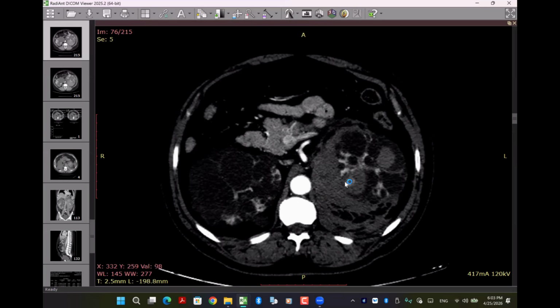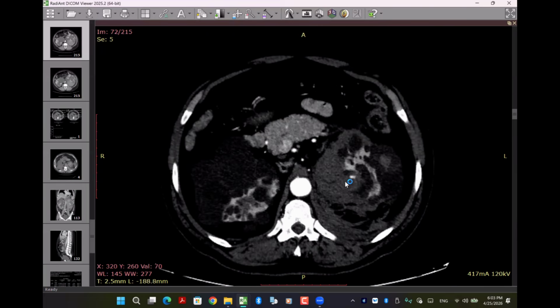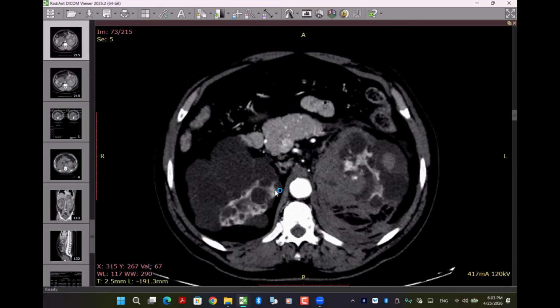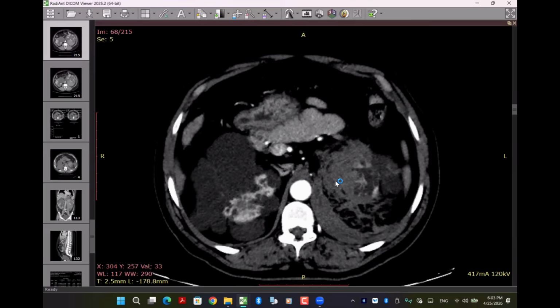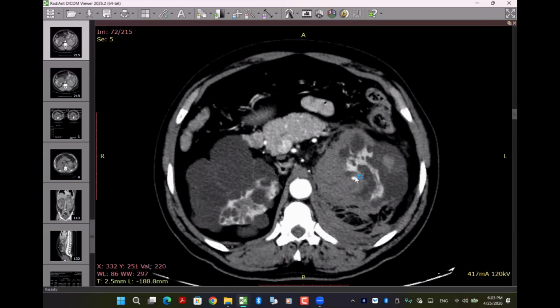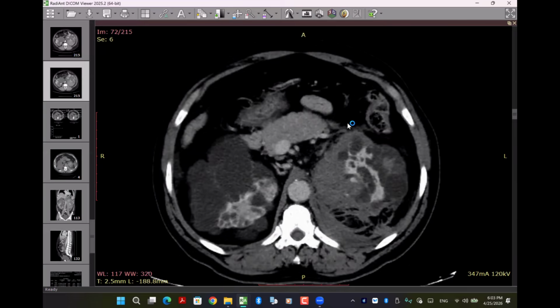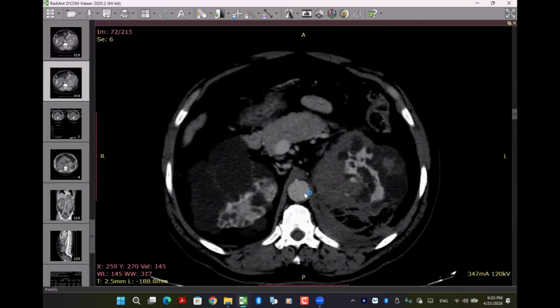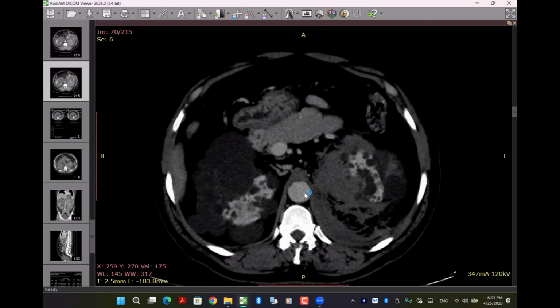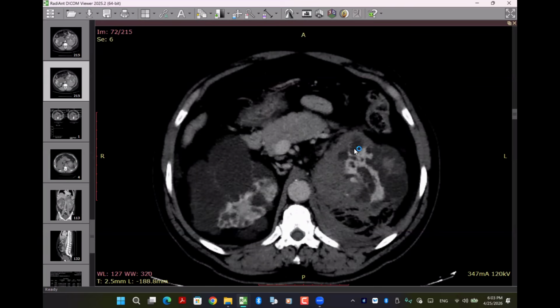Can I ask you, why did we do this scan in 2 phases or even 3 phases, but I forgot to bring the most important delay phase? Why did we do this scan? To look for any active arterial extravasation. How do you confirm it with the arterial? I will confirm it in the plane. No, I can't see it in the plane.